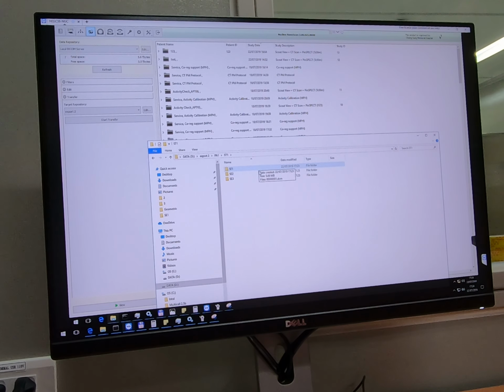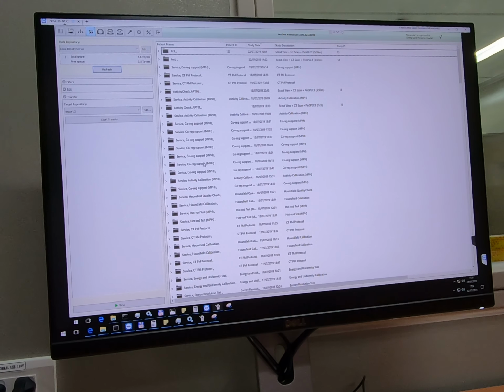This folder here, no, inside. Yes, inside it is. Yeah, that's the inside computer. So it's not stored on the outside nuclear one. But we could also do that on the workstations. It's the same process. But it's confusing because we are logged in there.